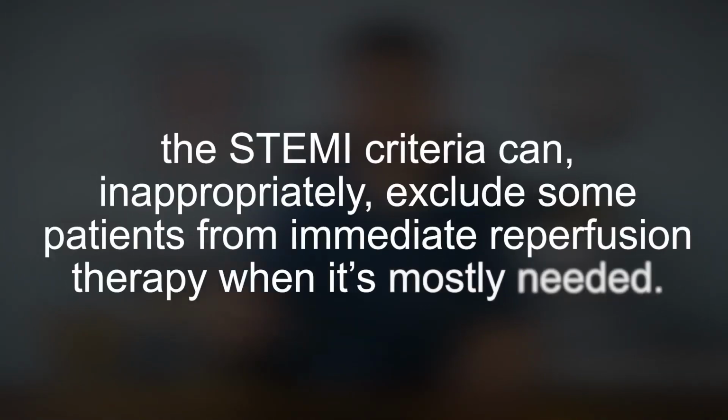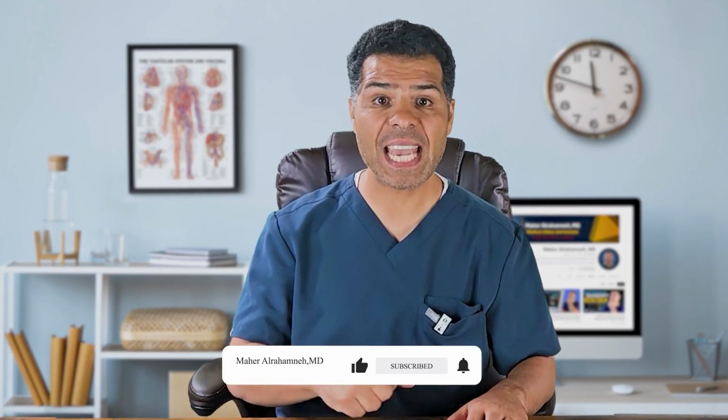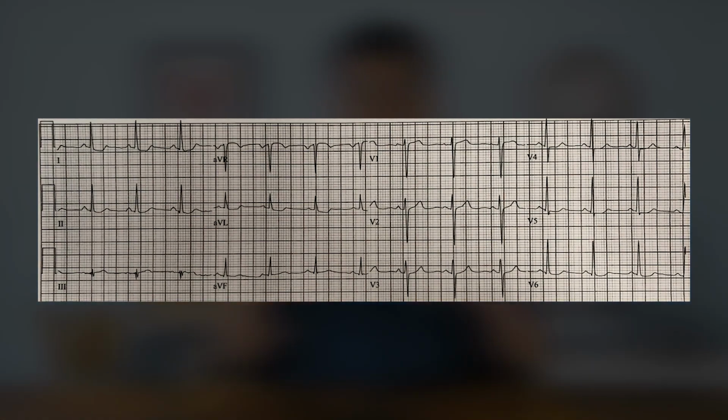This is another reminder that the STEMI criteria can inappropriately exclude some patients from immediate reperfusion therapy when it's mostly needed. If you see such a pattern in the right clinical context, activate the cath lab. But why is there no ST elevation in other inferior leads? There is only in lead 3, there is none in 2 or aVF.